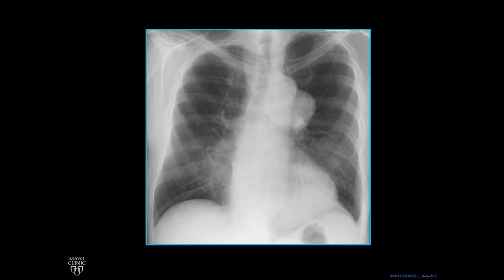Here's an abnormal chest X-ray. We see our aortic arch, and there's a second contour that you can see in addition to it. Because you can see a line going through it, it's not right on the descending thoracic aorta, but it's in the neighborhood of the aortic arch. Again, the most common thing in most patients probably would be some sort of mass, like adenopathy or a lung cancer. But the point of this is to show that these structures really are what I'm saying they are.